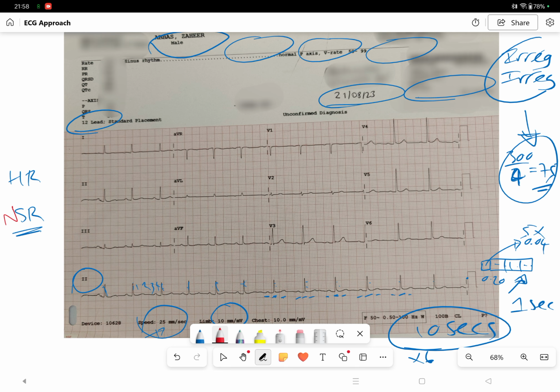If, however, the R wave intervals were not regular, but you were still able to ascertain sinus rhythm, so that you still get the PQRST complex all the way along, except there's irregularity in the R waves, then we are looking at something called sinus arrhythmia, because we've got sinus rhythm, but it's not quite rhythmic, is it? Okay, that's in that situation. In our situation, we have got normal sinus rhythm, as is evident in this lead 2 in our strip over here.